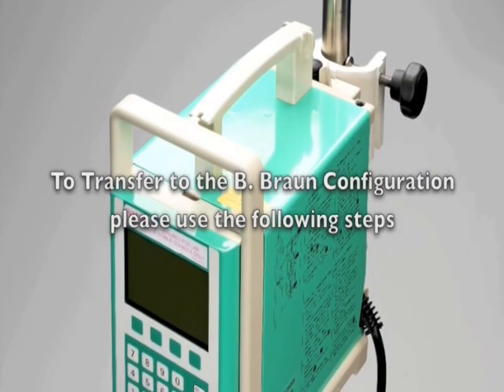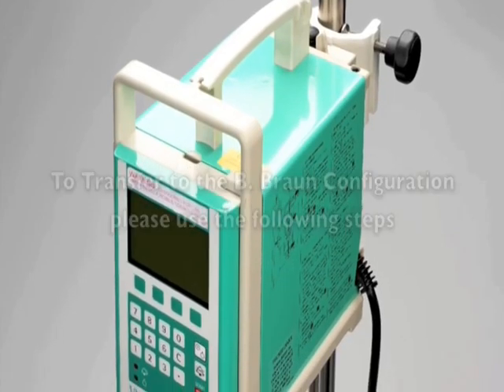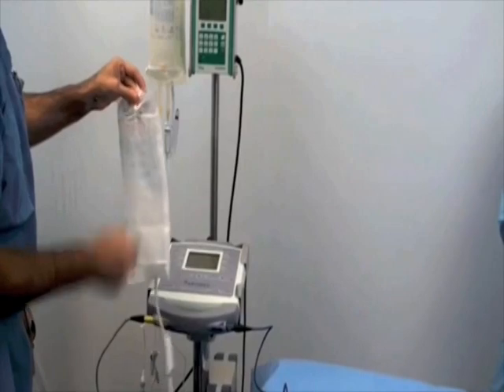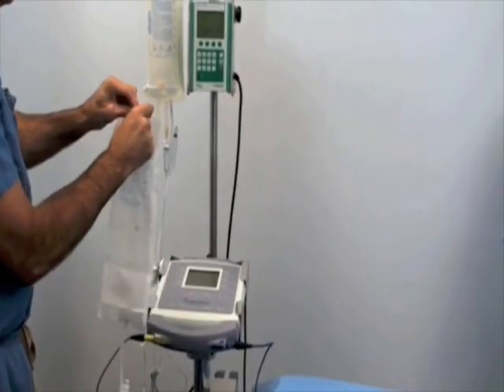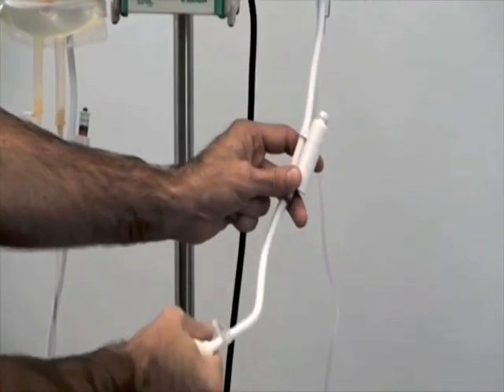To transfer to the B. Braun configuration, please follow these steps. Set up the sodium chloride bag with the pressure bag and the 96-inch straight IV tubing. Inflate the pressure bag to 300 millimeters of mercury.